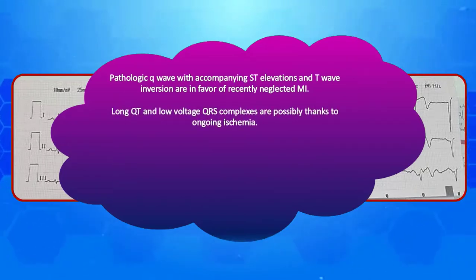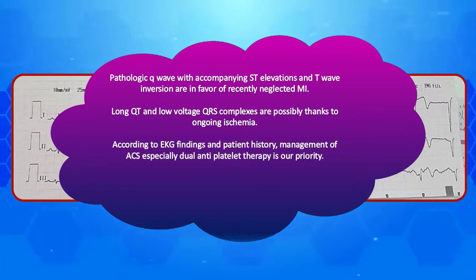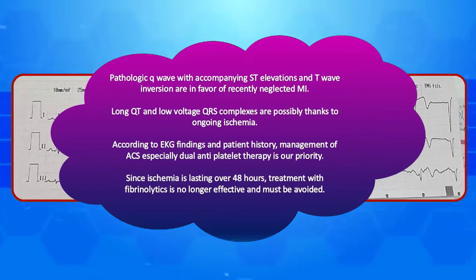Long QT and low voltage QRS complexes are possibly due to ongoing ischemia as well. To put it in a nutshell, nearly all EKG abnormalities are a result of ongoing ischemia. According to EKG findings and patient history, management of ACS, especially dual antiplatelet therapy, is our priority. Note that, since ischemia is lasting over 48 hours, treatment with fibrinolytics is no longer effective and must be avoided.